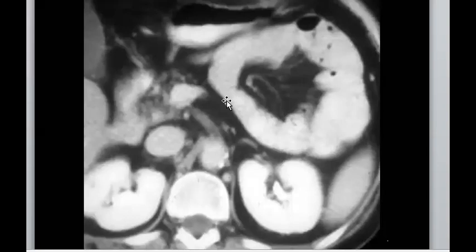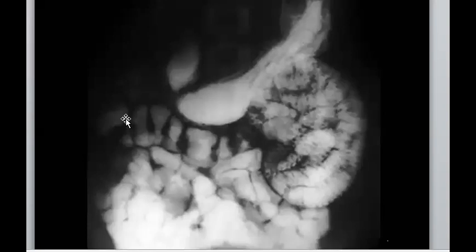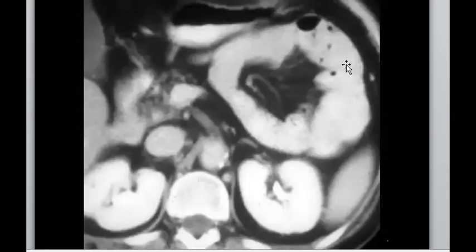And the most important thing is to follow the vessels. I cannot show you the other image, but I can see here that the mesenteric vessels should be engorged. Then it is typical for internal hernia. If you have multiple pictures and scroll through the other images, it will help you. But this sac appearance and the common location behind the stomach in the left paraduodenal region, so this is the most common type, paraduodenal hernia.